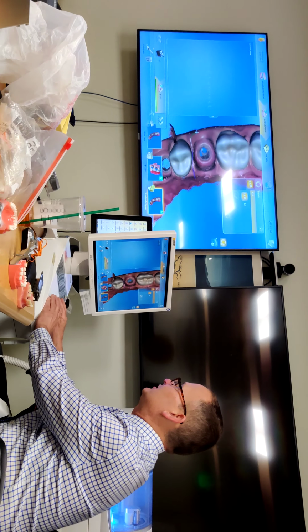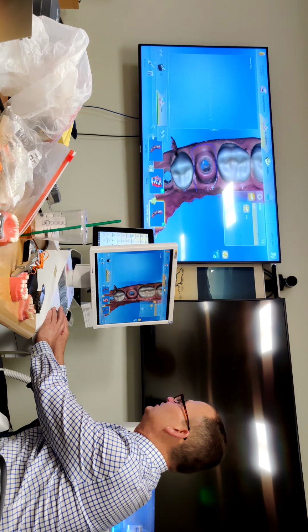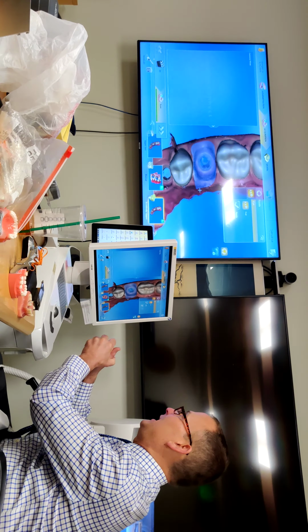Single click to set it, and keep setting points with single clicks. Then double click to finish it. And they should connect. You should be connecting back, okay?